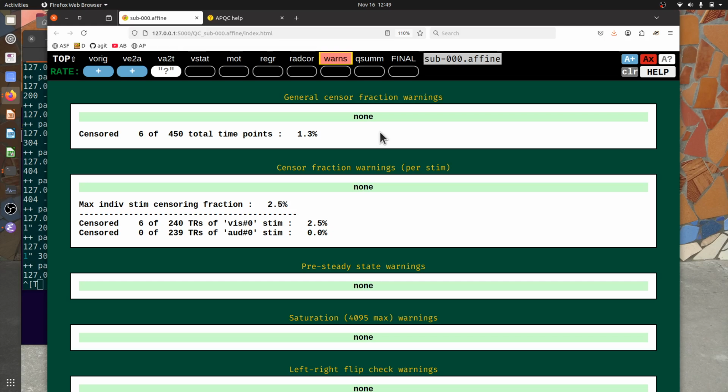What are the thresholds that we set for mild, medium, and severe? Are they absolute values that are set in stone? So if it's mild versus medium, these are just general guides, and you should always look at other aspects as well.